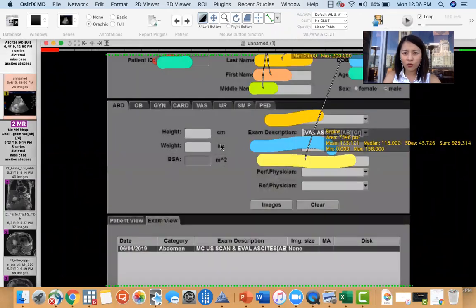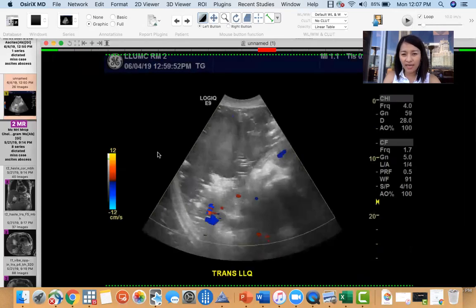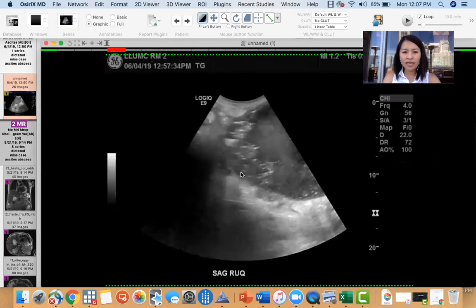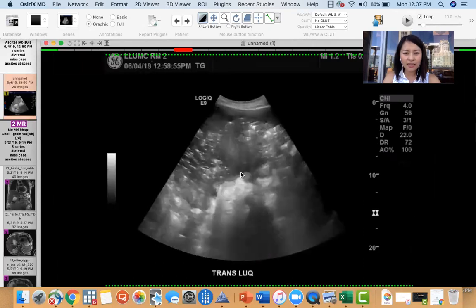So if you look at the ultrasound, this is what you're looking at, these pockets of free fluid, and you have these little punctate echogenic foci. The echogenic foci are air bubbles. So this is ascites that's been superinfected, and so they drained out just tons of pus. So this case is an example of infected ascites.